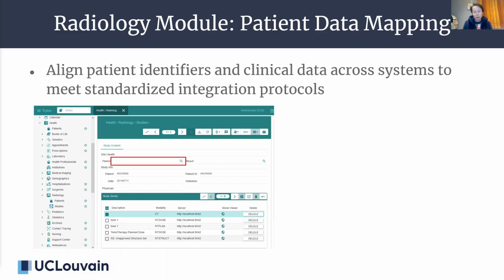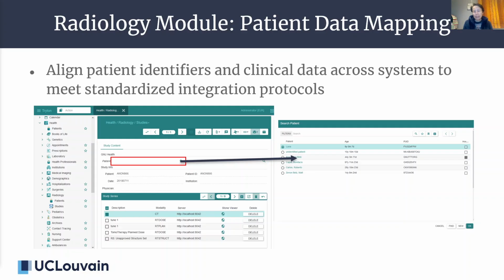The new model allows users to manually link patient data with image data: select a study, select the Find the Patient button to open the patient list page, and then select the patient. Once linked, the patient's image data can be displayed in the Orthanc view, and each image instance can be previewed. A semi-automatic mapping feature is planned to reduce the workload for the doctor.